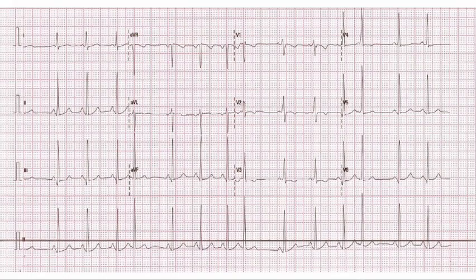Another case, this is not an ECG course, I know, but it's still important. 14-year-old female, palpitations. Diagnosis? Oh, very smart. Very fast. Despite you sniffling. Very good. Okay, Wolff-Parkinson-White. Yes.